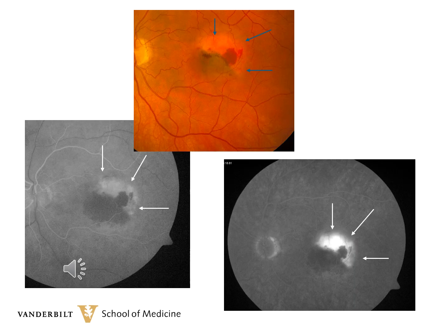The early hyperfluorescence comes from the choroid, and later on there is staining of the choroid. But note, the extent of the hyperfluorescence does not extend beyond the area of the loss of the retinal pigment epithelium. Both the curled up RPE, which is now thicker than usual, will block dye, and the retinal hemorrhage also is blocking dye on this angiogram.